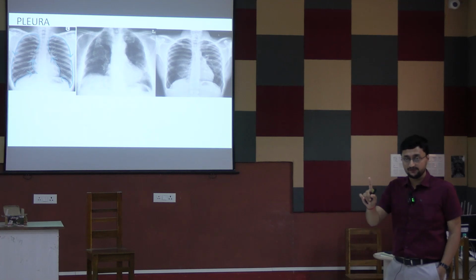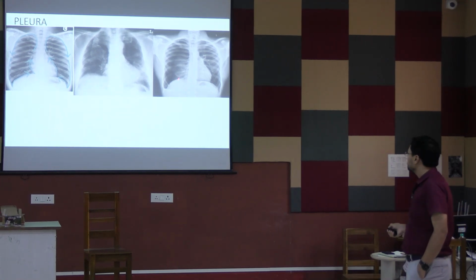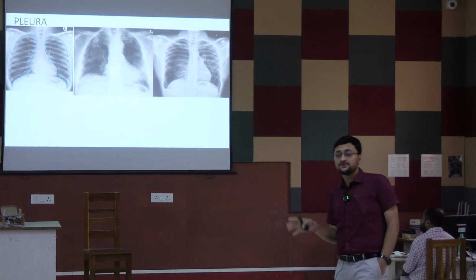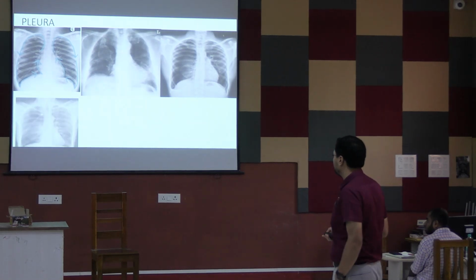This is the first point. Second one is visceral pleural line. So this is the visceral pleural lining. ঠিক আছে? So these are the most important points to detect whether the patient is having pneumothorax or not.